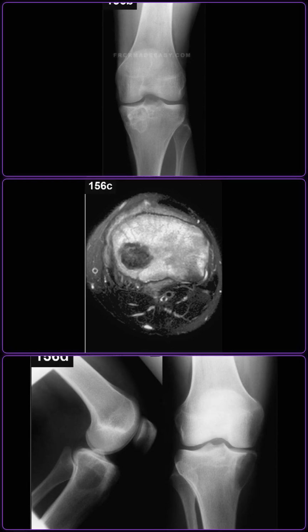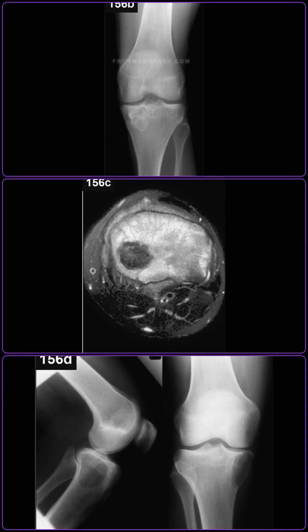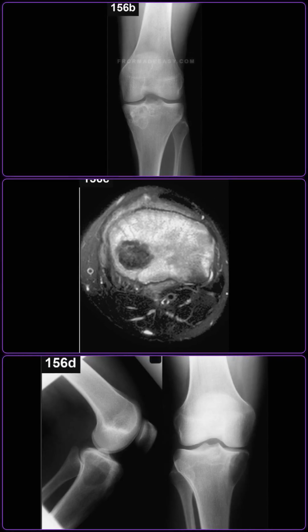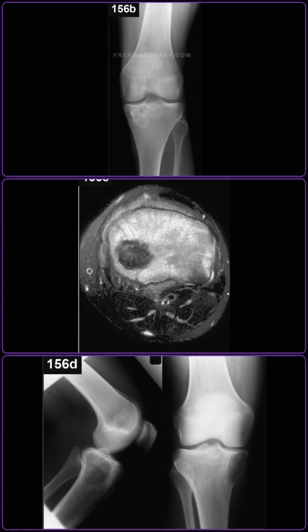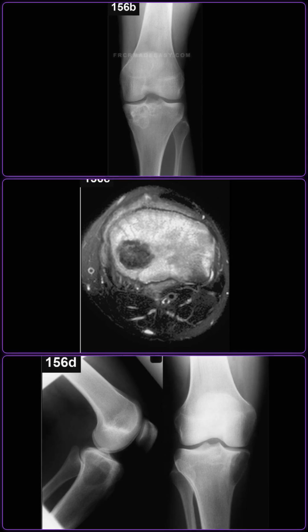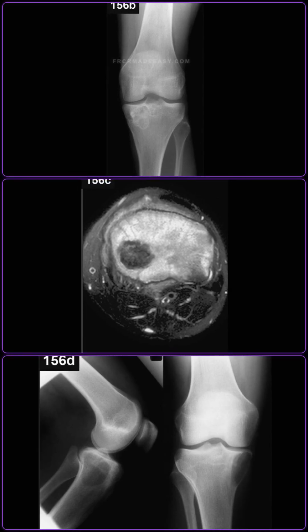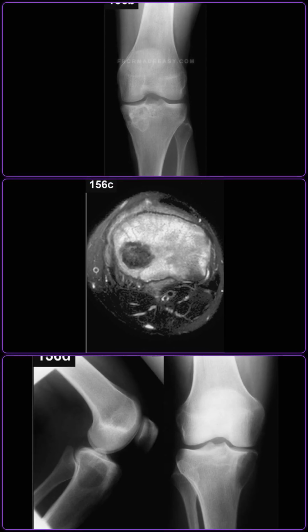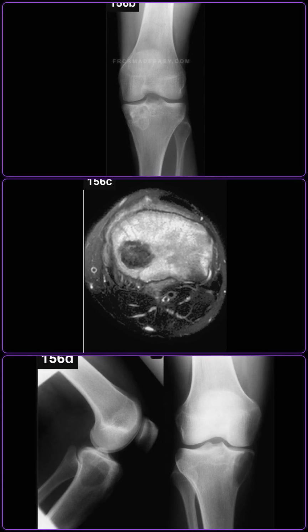I am showing you comparison radiographs and magnetic resonance images of other epiphyseal lesions. Describe the findings and how they assist in differentiation. The comparison plain radiograph of the tibia demonstrates a well-defined epiphyseal lucency, while the corresponding T2-weighted axial magnetic resonance image shows a hypointense epiphyseal lesion surrounded by extensive hyperintense bone marrow edema throughout the tibial plateau.